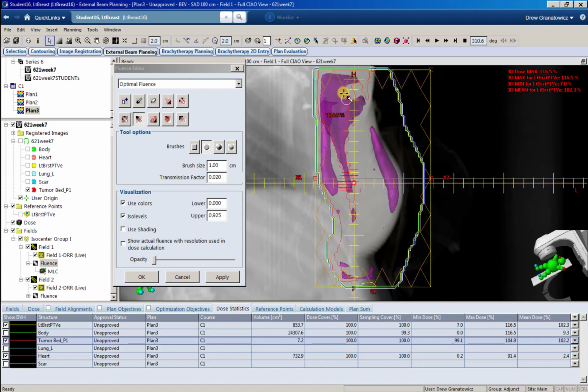And same thing, 0.02 is kind of similar to my 3% for field and fields. It's hard to screw up if you just start with 0.02, but the more comfortable you get with this technique, you can start adjusting that 0.02.